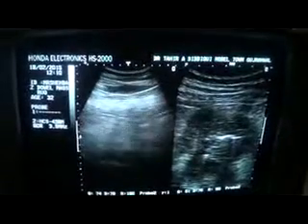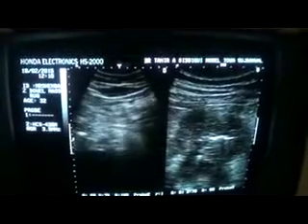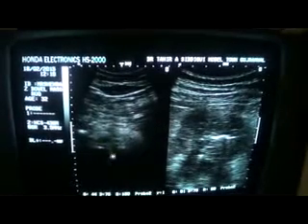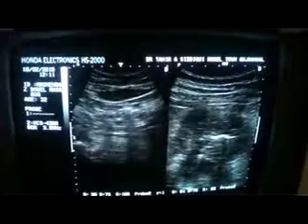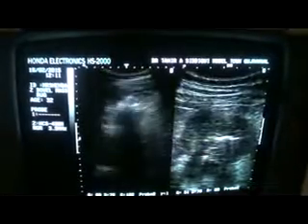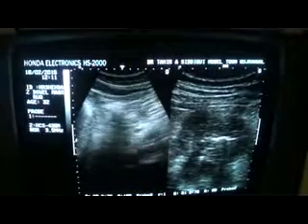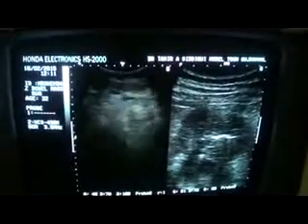Then we see the pancreas, does it relate to the pancreas or not? This is the pancreas. This white band of tissue is the pancreas, splenic vein, superior mesenteric vein, superior mesenteric artery. This is the aorta. And you can see that it does not relate to the pancreas as well. So is the spleen involved? Let's see that. No, the spleen is normal. This is the spleen, as is the left kidney. This is the aorta, no para-aortic adenopathy seen.